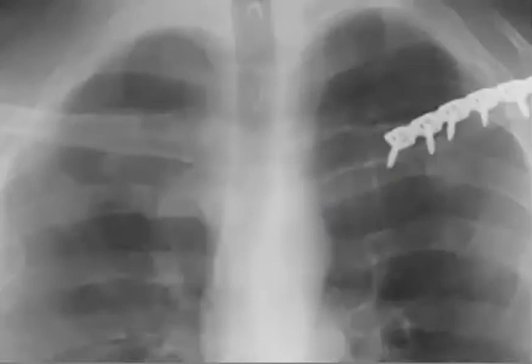So let's go to the X-ray again. Just a few starter image cases, then we shift to another level, inshallah. Okay. So what do you think about this one? Do you see any abnormality? Fracture of the clavicle? Yeah, maybe the clavicle has an abnormality. What is the abnormality you could expect?